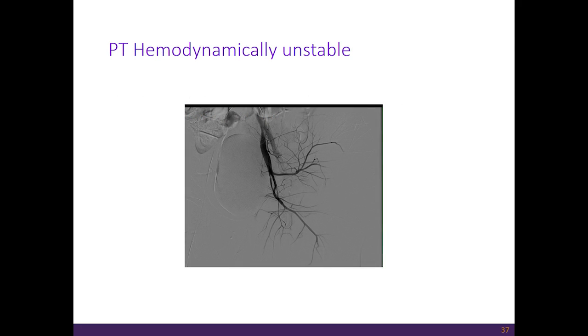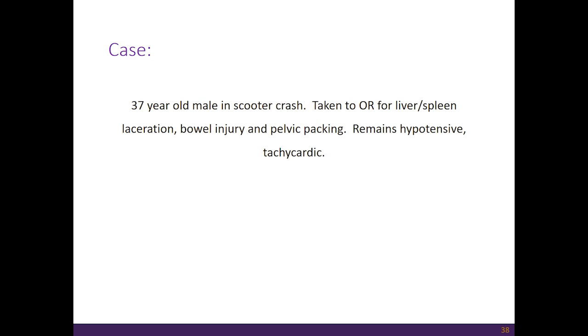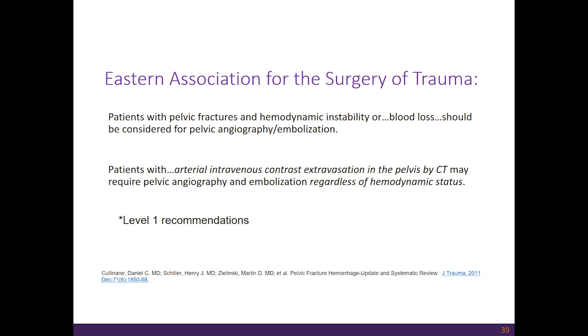Which leads me to when to know to call the interventional radiologist. So when are patients hemodynamically unstable? Here you have a selective angiogram from that same patient whose kidneys were not enhancing on the delayed imaging. So this was a 37-year-old male in a scooter crash, taken to the OR for liver and spleen laceration, bowel injury, and pelvic packing. He remains hypotensive and tachycardic.